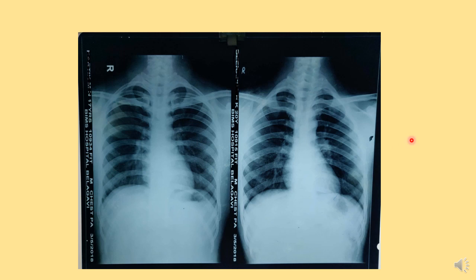In this slide, I have projected two different radiographs of the chest of two different patients. So let us look at this. This is the right side. You can see lung fields and soft tissue shadows and also bony markings. This is a simple radiograph of the chest, PA view. In the chest it is always a postero-anterior view.